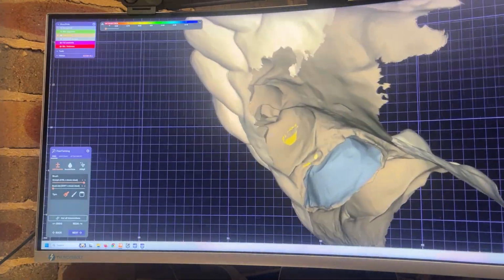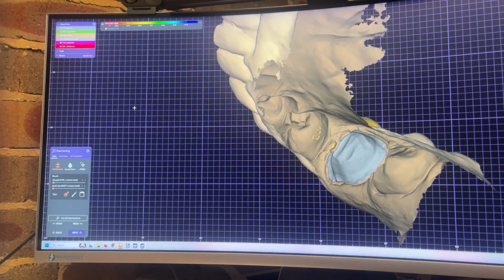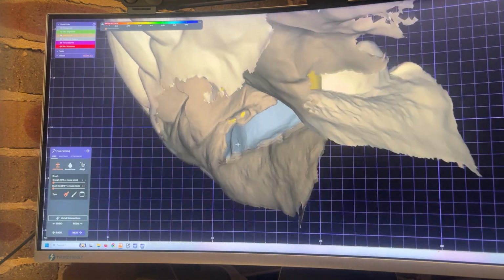Alright, double check over this one. Contacts. Ooh, you see something? What do you see, Ashi? The blue stuff. What blue stuff? Over there. Where on the screen? What blue thing? Hey, go back. This one here? Yeah. It's grey. It's grey. All right. Blue.